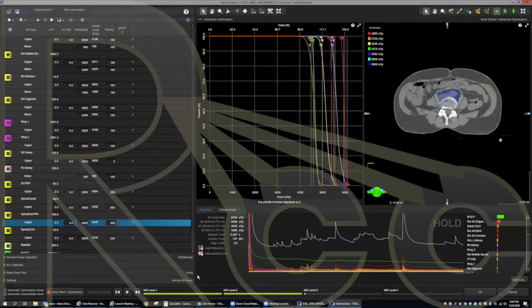But the good thing is, if you just do it slowly, systematically, even if you have that many PTVs, that many organs at risk, it doesn't get overwhelming because you just do one at a time. Yeah, I agree. And that's a great technique, actually. See how you started with the PTVs and the rings, and then one by one, you were basically just patient and consistent.